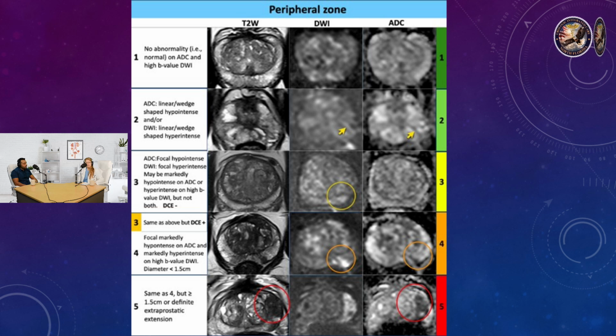So when you look at these images, number 1, for example, we were talking about this with Manish because they could have chosen a better image. Actually, the peripheral zone in a T2-weighted image should be completely bright, white bright, without any tinge of gray, and that would be a PI-RADS 1 in my book. But I chose this just because it's a little different. What this demonstrates is this dark region on the T2-weighted image in the middle, and that's likely prostatitis. But there is nothing really bright.